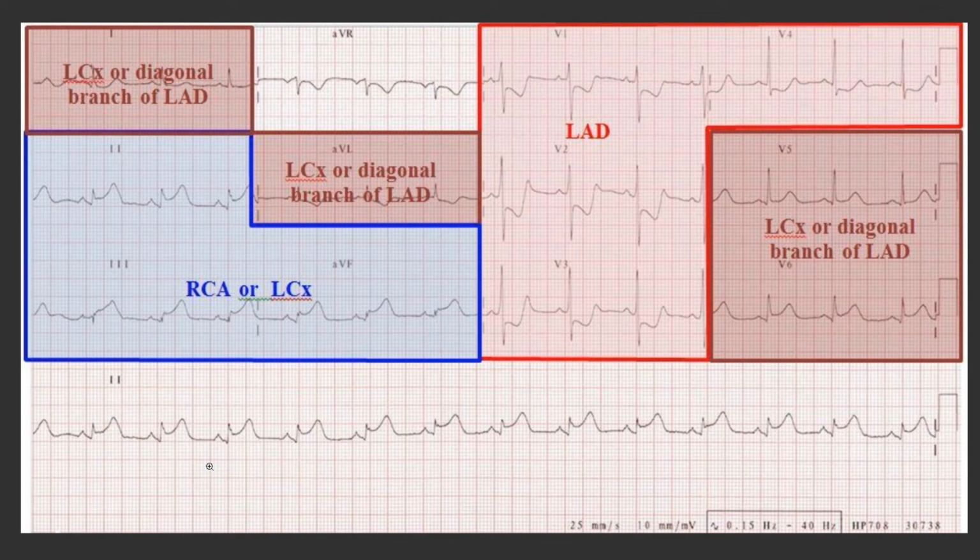In my previous lecture, I showed you a nice diagram about the heart and its anatomical relation to the ECG leads. Well, this is another version of that, but on the ECG graph paper. You can see 2, 3 and aVF for the inferior part of the heart, seen in an inferior MI, and the blood vessel corresponding to it being the right coronary artery. The lateral being 1, aVL and V5, V6 being left circumflex, or a bit of the left anterior descending. V1, 2, 3 and 4 being anteroseptal, and the main problem will be the left anterior descending.